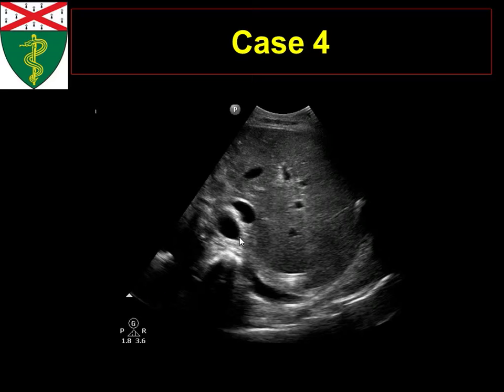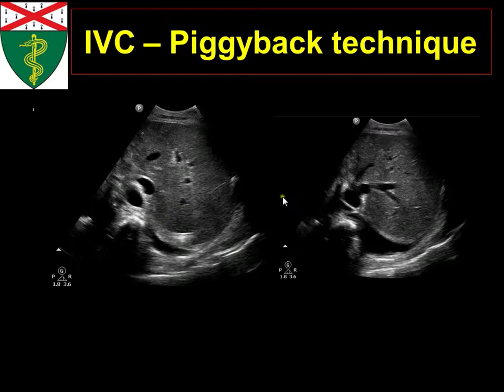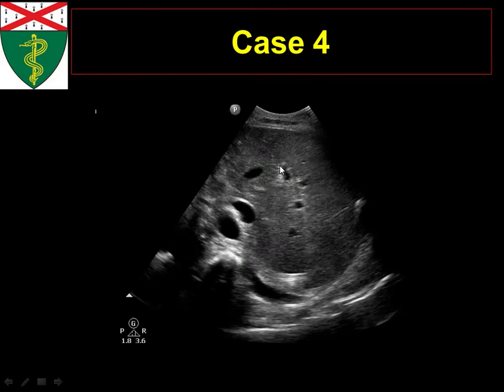All right, so what if I show you this image? So this is that, and this is that. Actually, up there. So this is basically a pitfall. If you see something like this, and I've had it happen to me, this is why I want to show it to you. Technologists will come in and say there's a little collection over here, and it's a small collection, so it doesn't really matter if it truly is a collection.